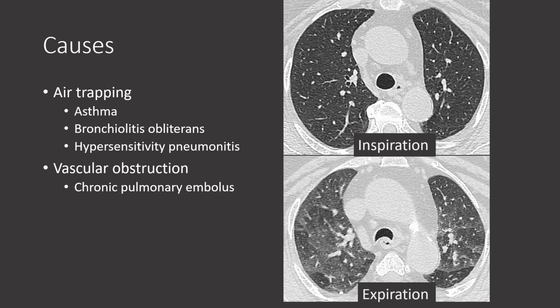One way we can attempt to differentiate them is to perform inspiratory as well as expiratory phase imaging. Notice the shape of the trachea during inspiration versus expiration. The wall is bowed inward when breathing out. Also notice how most of the lung becomes more dense or white during expiration.